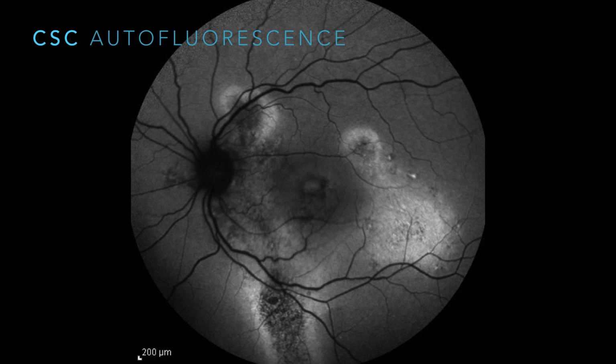If you look at the superior portion of this image, it's kind of got a gray, uniform, homogeneous gray background outside of the blood vessels. That's your normal RPE autofluorescence. When the RPE gets overloaded or gets sick, has taken on too much lipofuscin, A2E, other fluorophores that come from the outer segments, it becomes hyper-autofluorescent, and then when it dies, it becomes hypo-autofluorescent, becomes black.